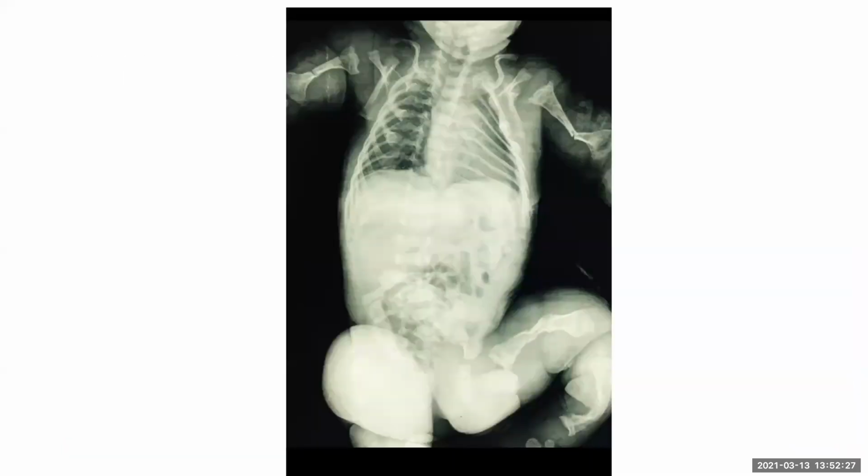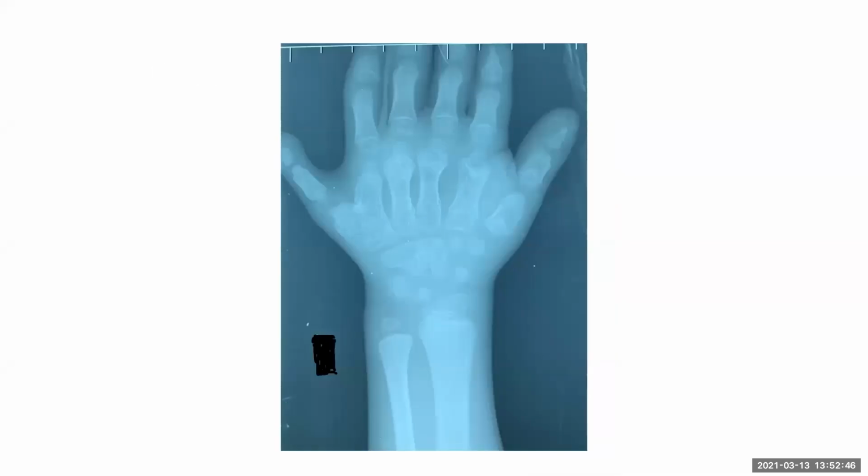Another crying neonate. You see, this is very typical. Bone density is reduced. So many fractures. And this was osteogenesis imperfecta. Another short-statured patient.